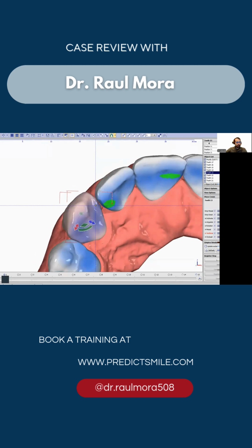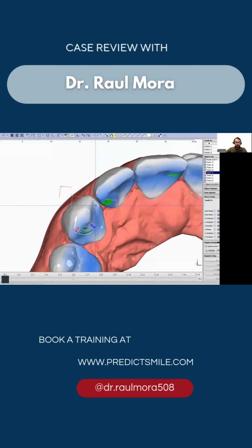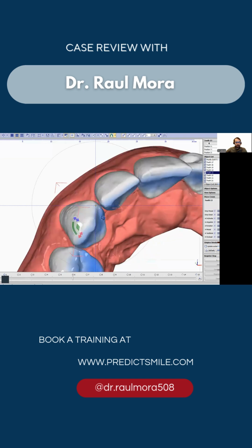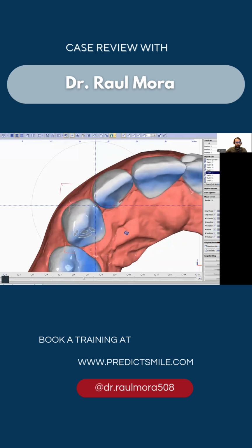round tripping. Just let me work something in the staging now, and there we go. So now we're going to have the buccal movement of the canine that we didn't have from the beginning, and we are leaving space for the lateral, which is something very important. Actually, I'm going to move the canine a little bit further, the comeback movement of the round trip a little bit forward so I can leave even more space. So we go forward and then the round trip starts.